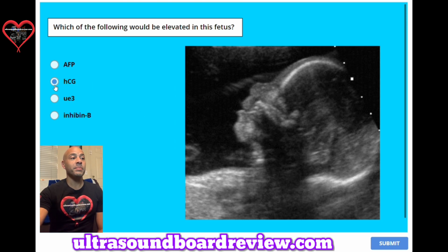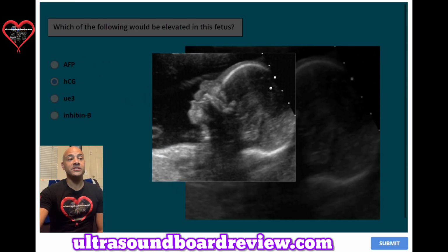The answer is B. HCG. This ultrasound represents a fetus with an absent nasal bone.